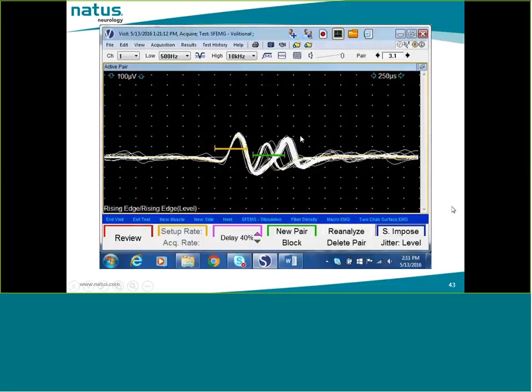Now let's use these principles to analyze some single fiber EMG recordings. Here is the first signal. This recording contains discharges from 2 different motor units. Here is the triggering action potential, which is quite similar for both motor units. For one motor unit, here is the jittering potential. This is what we will observe initially in the signal, and towards the end of the recording, we will see discharges of the second motor unit, where the interpotential interval is shorter. Let's look at the signals.